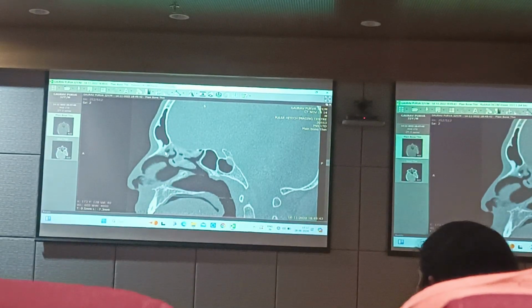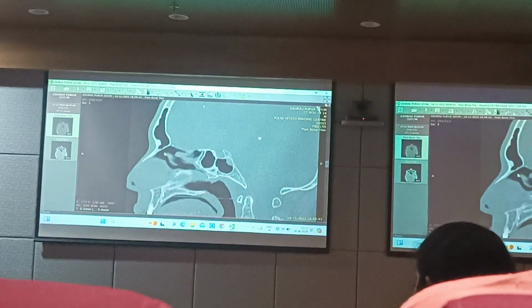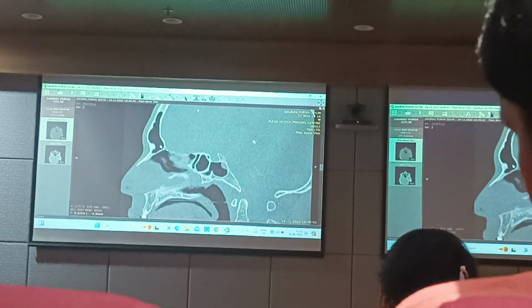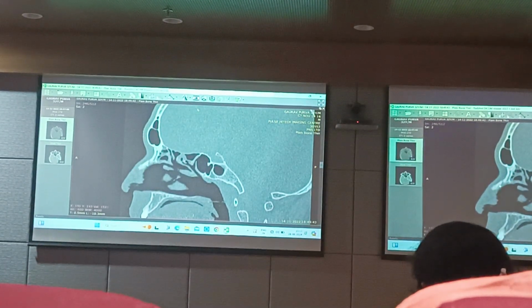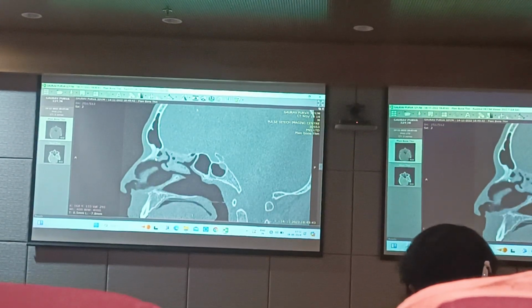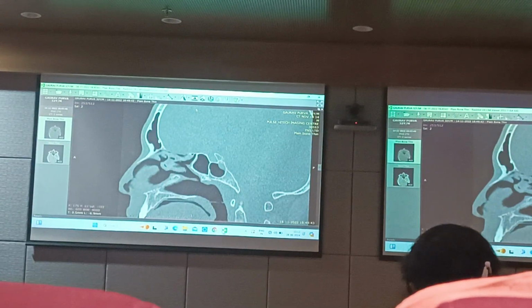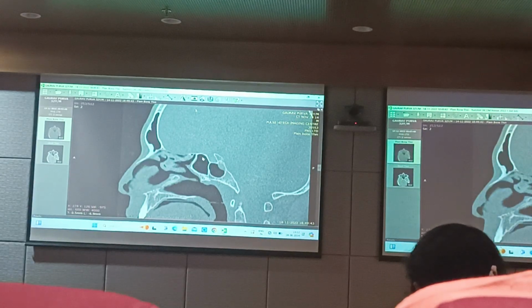And then what do you find? It's becoming like the frontal recess, right? Is this clear to everyone? So where your frontal beak ends, the frontal recess starts. Ahead of this, can you see the frontal beak? This is the front. You can still see the nasal bones, right? Keep coming back, and you start seeing the frontal recess over here. Can you see the posterior part of the area? This is all skull base, right? This is the middle turbinate, and that's the sphenoid sinus.